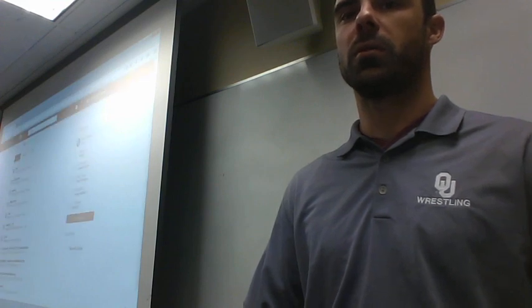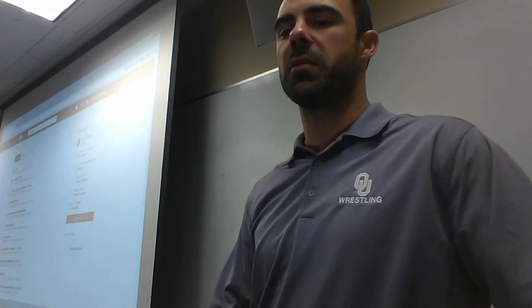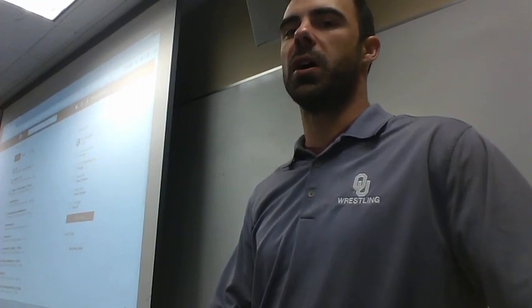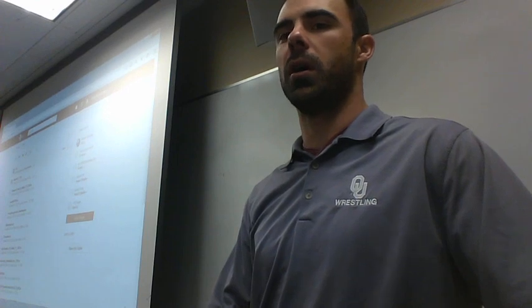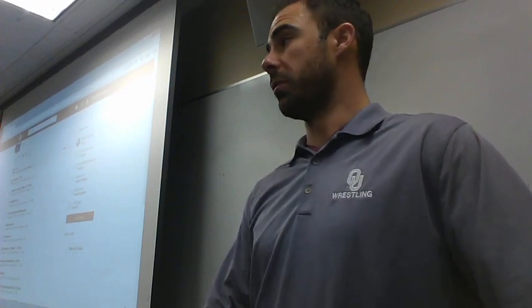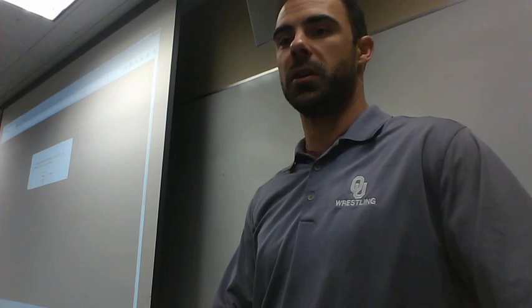Now your folder is called EEG right now. That might change over the semester, but right now we'll just call it EEG. And you downloaded just about everything in here last class, except for this folder that I added new. It's called BDF. So all we're going to do is check that box there. It'll highlight the row horizontally, and then basically hit this button on the top left, which is the down arrow for download. And it'll say it might take some time.